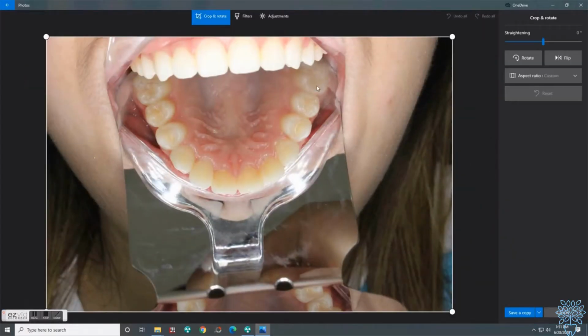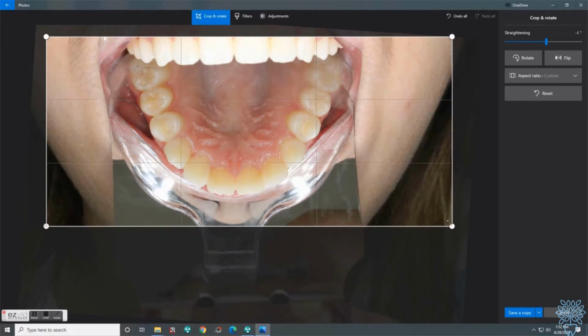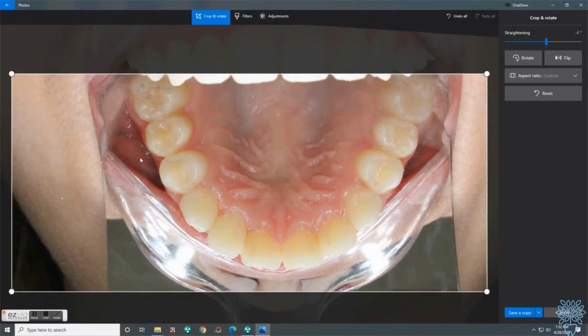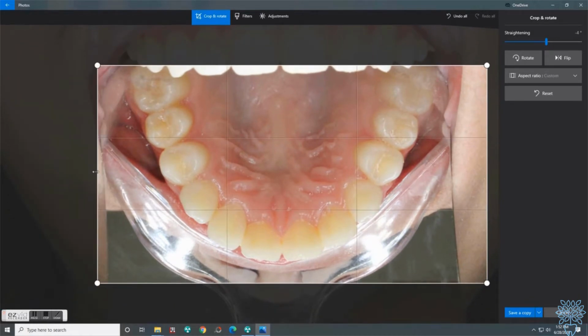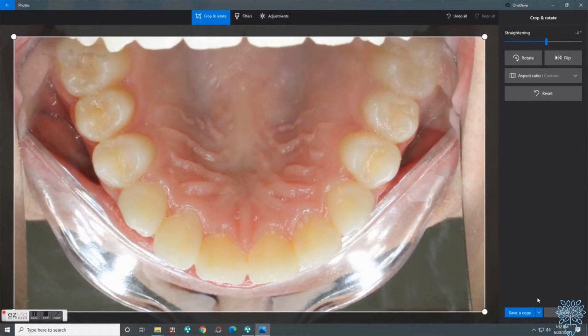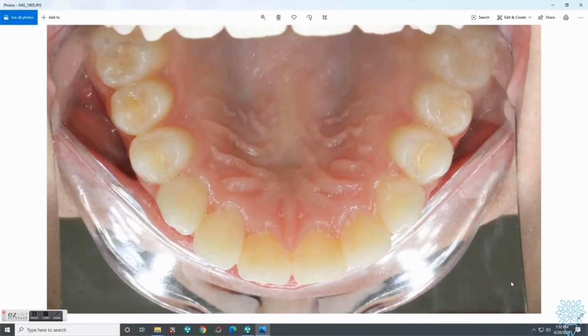This is a good one because we want the molars on these ones to look the same, so they're slightly rotated. So I can straighten until I think it's as good as I can. And I'm just going to do the best job you can. On this one, we might still show some of the maxillary teeth. Obviously, we don't want to show that, but we're going to show some of them, it looks like. And that is just life. That's how it goes sometimes. Maybe she couldn't open up that big, and that's how it's going to look.